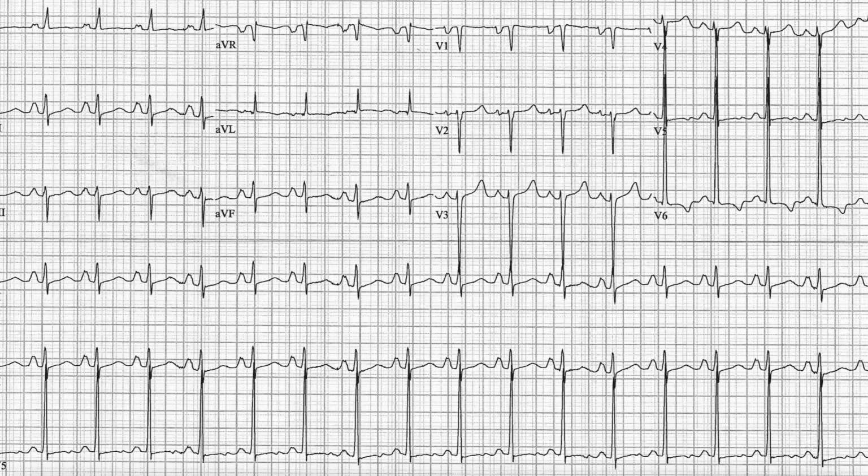Again, as always, take a minute, look at the thing, pause the video, really analyze it, go through the algorithm, and then come back when you've got it interpreted. Okay, let's take a look at this EKG.